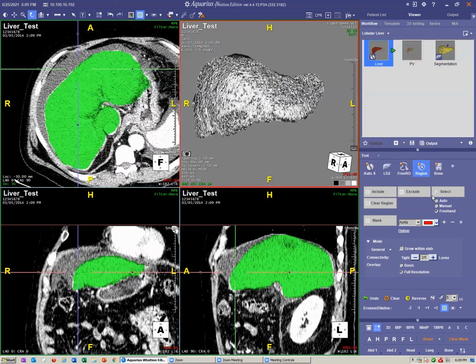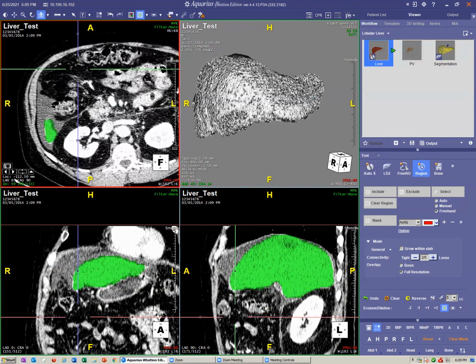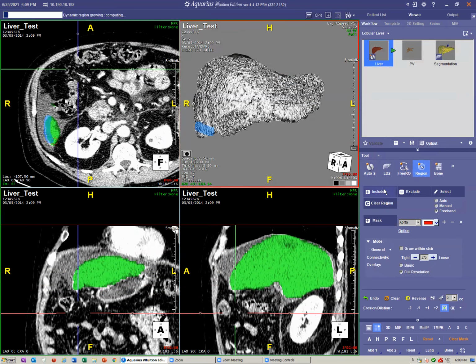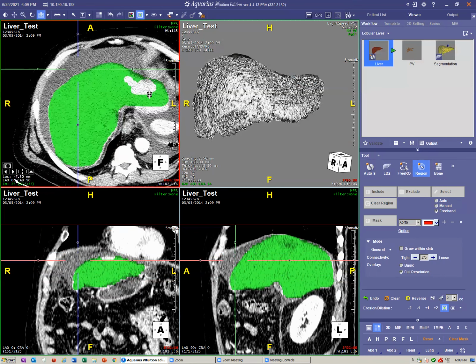You can also do the freehand option on the region of interest tool to include areas that you missed. So it's kind of nifty if you want the freedom. So that's the free region of interest freehand option right there, include. And you can do the same to exclude as well, highlight whatever has bled out, like here, for example, exclude, and some swath of heart here, highlighting, exclude. So two options. Plus, I kind of cut out some of the liver here, so I'm going to go back to region growing auto.